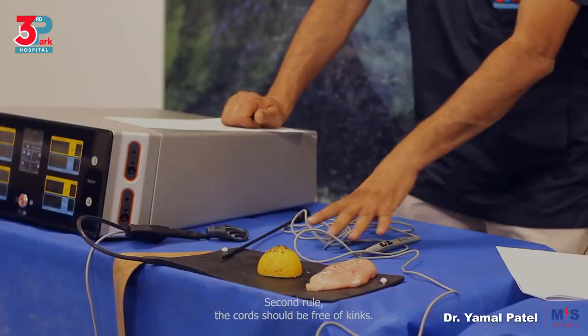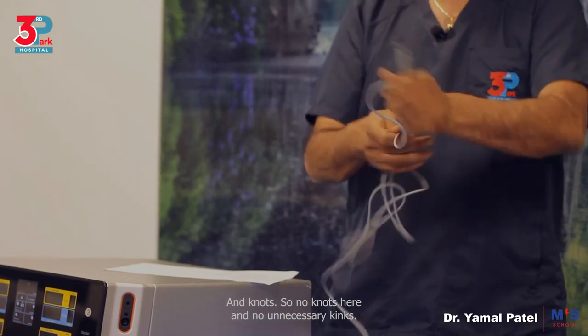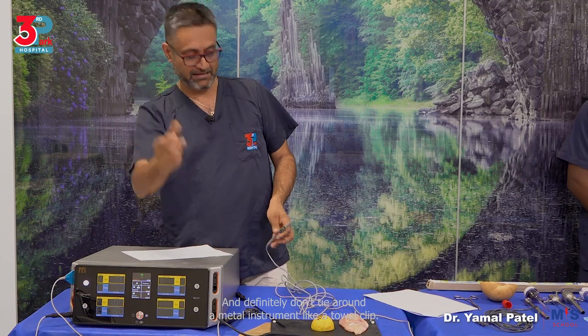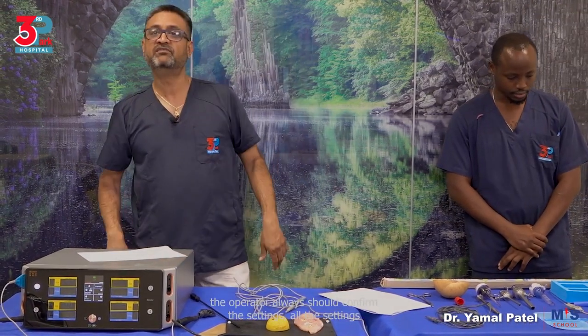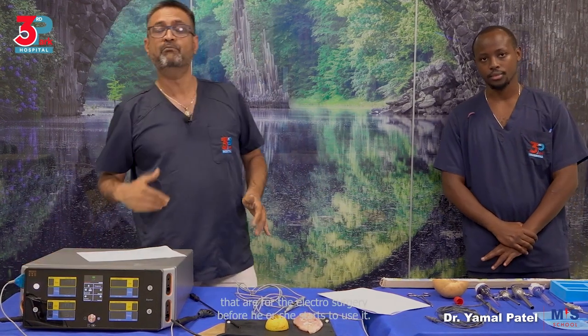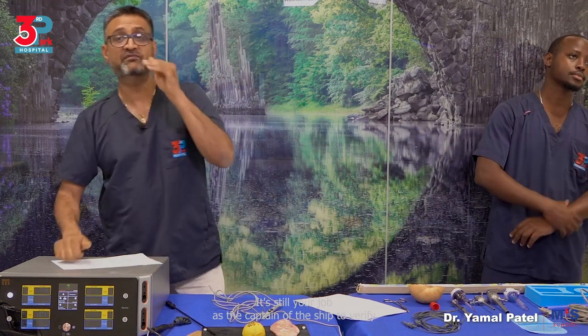Second rule, the cords should be free of kinks and knots. So no knots here and no unnecessary kinks, and definitely don't tie it around a metal instrument like a towel clip. The third thing, the operator always should confirm the settings, all the settings that are for the electrosurgery before he or she starts to use it. It's not the job of the staff around you to do that for you. It's still your job as the captain of the ship to verify the settings, confirm the settings, and then start off with using it.